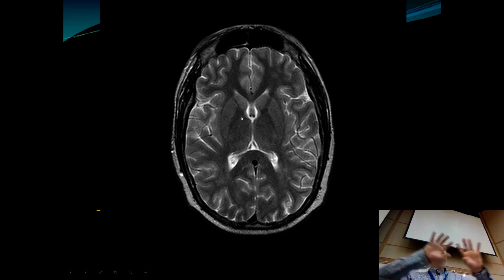Everything we're seeing here that is dark is still middle cerebral artery. And remember, it extensively branches out to supply the lateral hemisphere. The anterior cerebral artery, we just see a little bit right there and there. The little dark areas here will supply the midline portion of the brain. All right, so what's a gyrus that sits right on top of the genu of the corpus callosum? That's the cingulate gyrus, right there.